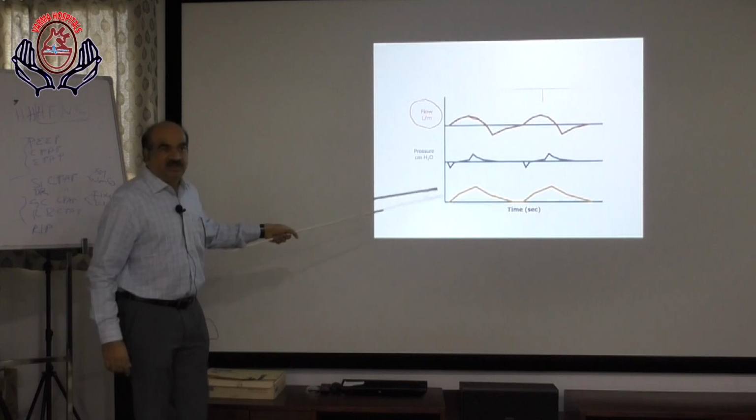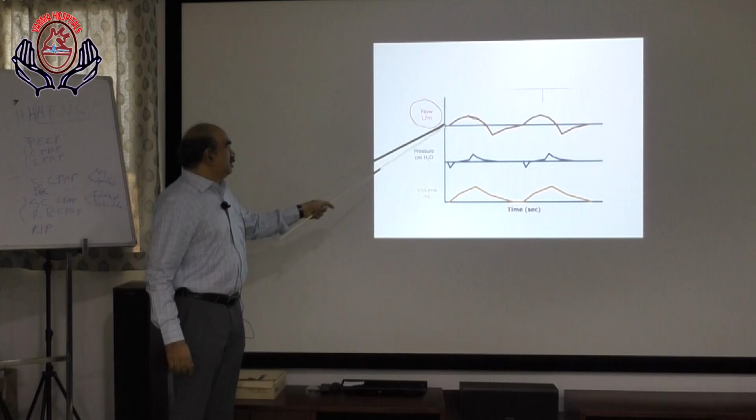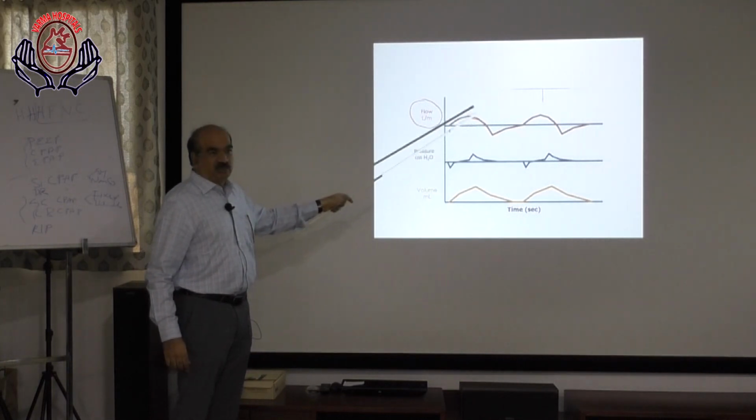What does it indicate? This is spontaneous breathing. The simple spontaneous breathing, because the flow pattern is a sine wave pattern. This is spontaneous breathing.